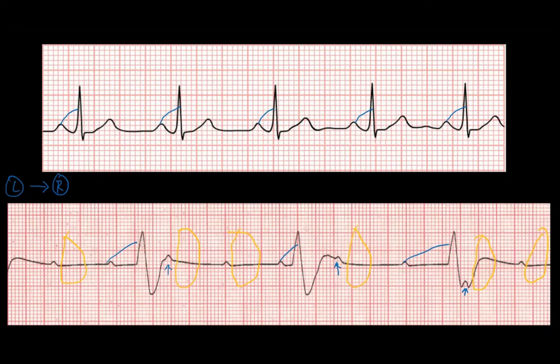So when we ask the question, P waves for QRS, and this is what I say is reading left to right, our answer to that is yes. But when I reverse it, QRS for every P, the answer here is no, and that's when I move this way. Okay, so I read in one direction and I just reverse it.